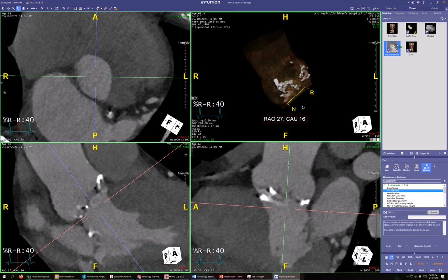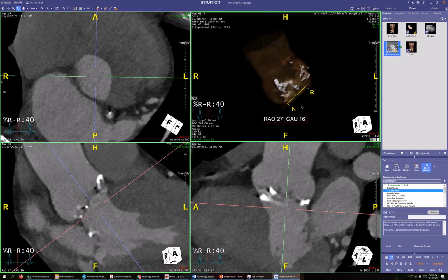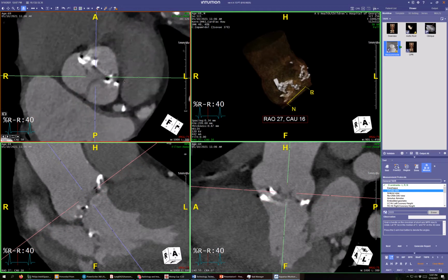I'm not quite lined up perfectly. Can we do any better? No. So you see here in the corner we've got it. It no longer looks like a perfect oval. It looks more like a, I don't know what, a guitar pick, a slug. I don't like it. You know, I like it when it looks perfect.